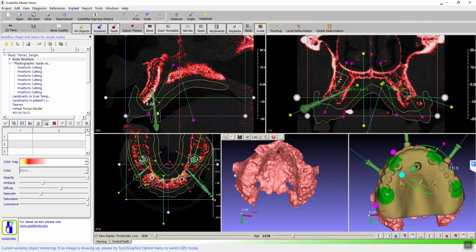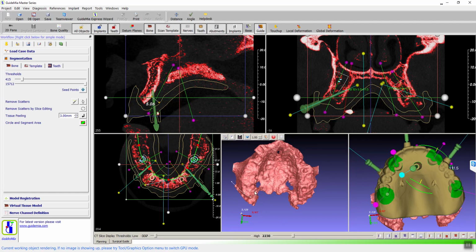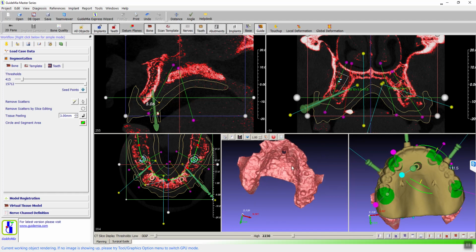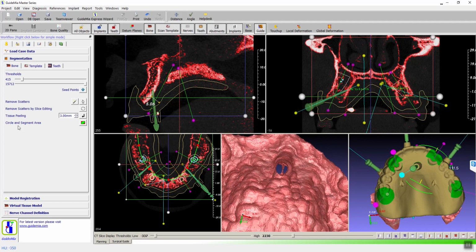I'm going to do another trimming to this with my scatter removal tool. So I'll trim this area for now. So for bone reduction guide, we really need to trim the bone model to the minimum. It's still quite a bit, but I think we should be fine with that. I'm going to take away this area too, because those are the areas which actually can cause trouble. I want to avoid those things.